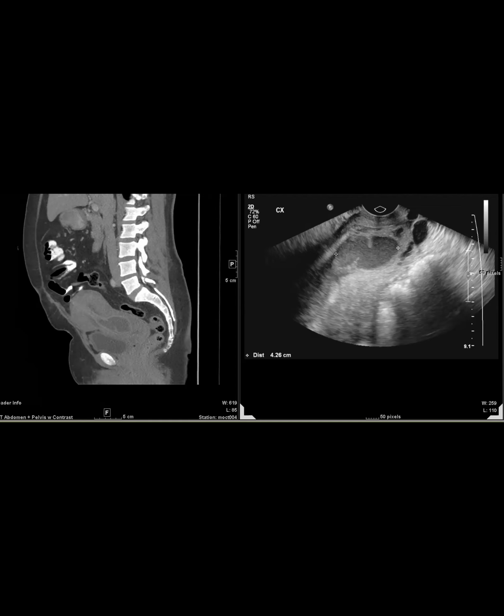So they did a hysterectomy. And any thoughts? I would have never guessed it. It was actually adenomyoma. It's a path. So it's cystic adenomyosis. It was just path-proven adenomyoma.